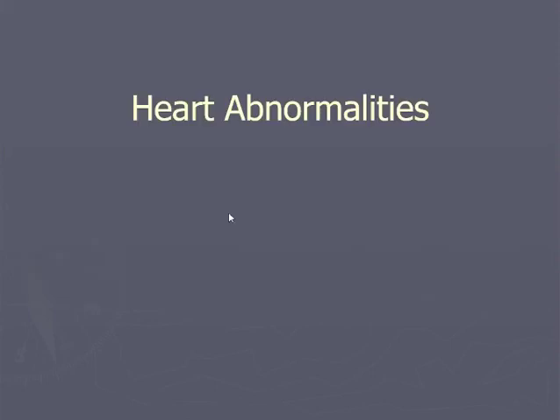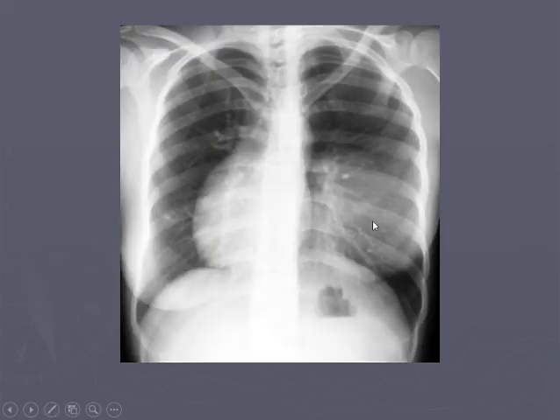We'll just move on. So heart abnormalities. You see this and you say, did they put the marker on the wrong side? But you won't be tricked by this because you do your x-ray reading in a thorough manner, because we have our airway with the carina, we have our bones, okay, we have our C for cardiac, okay, it looks like the heart is flipped, but maybe they put the film up backwards, maybe it's reversed, we don't know. Let's take a look at the other things.